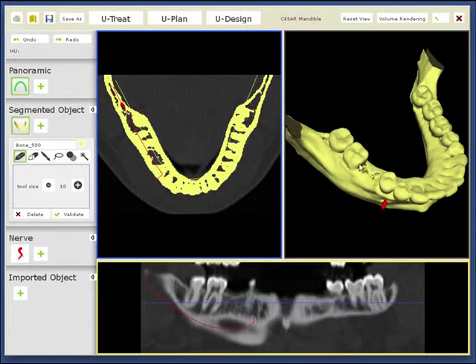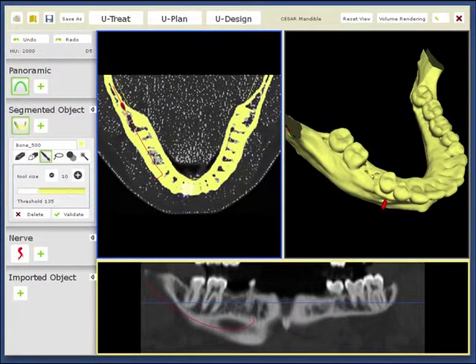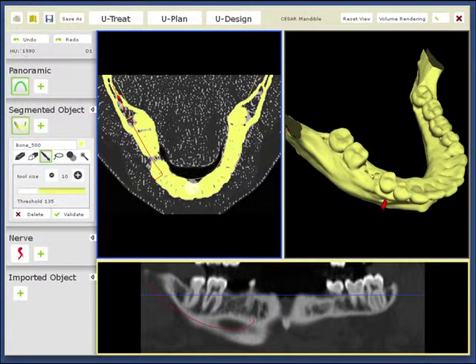If I want to increase and improve this, and this is very important when we work on bone with a guide laying on the bone, then I can reduce this. You see that I can fill the area. I go up to the place that I want to fill, and look, I'm working on the left side, and I'm going to change the image on the right side.